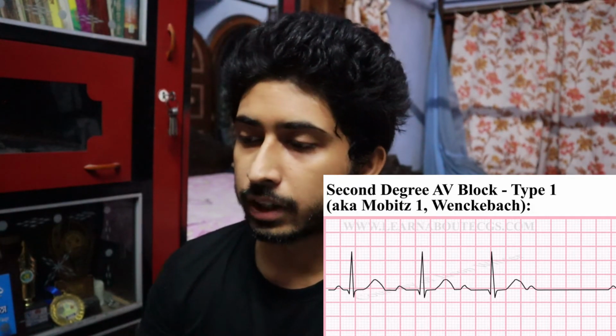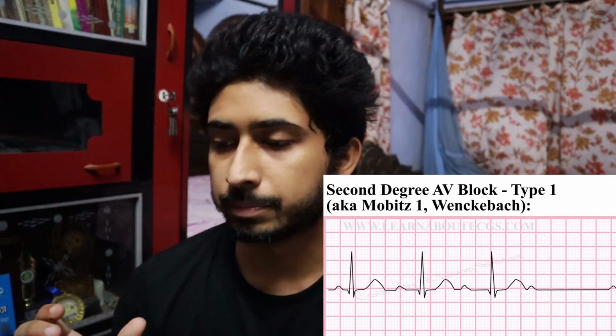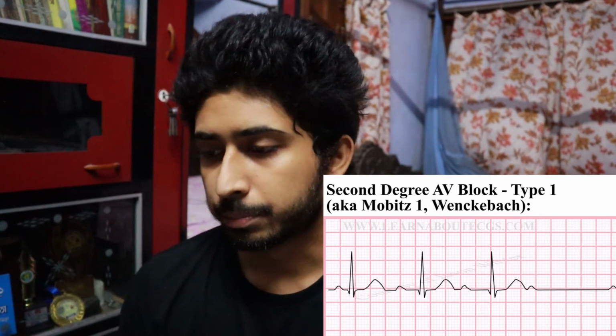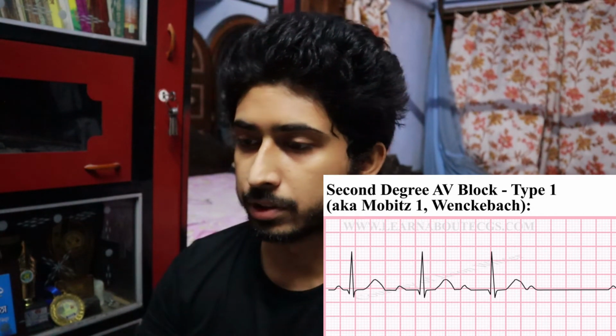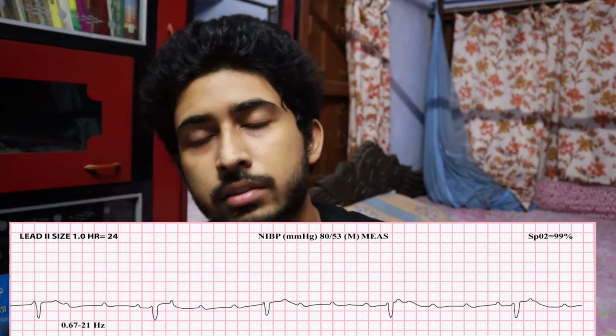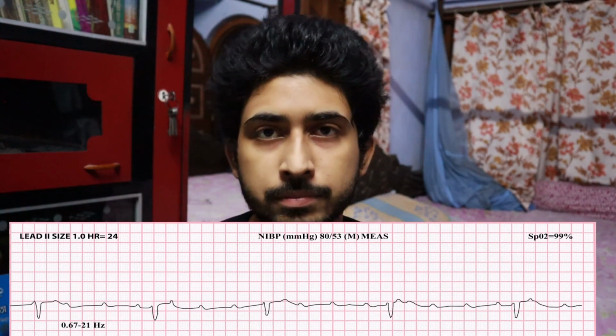Second degree AV block, this is Mobitz type 1, where the PR interval progressively prolongs, and after that one QRS complex is missed. This is Mobitz type 1. And this is Mobitz type 2, where the PR interval is constant, unlike Mobitz type 1, but a QRS complex is missing. In third degree AV block, we know that no impulse goes into the ventricle.